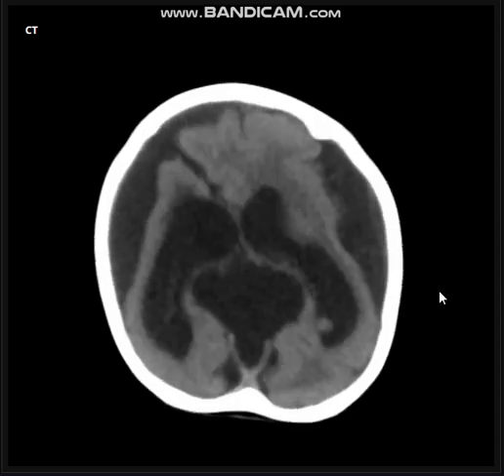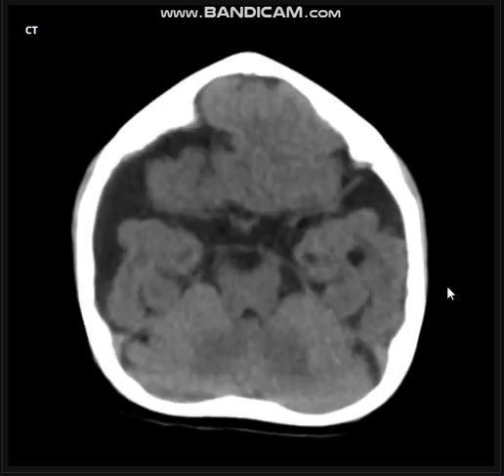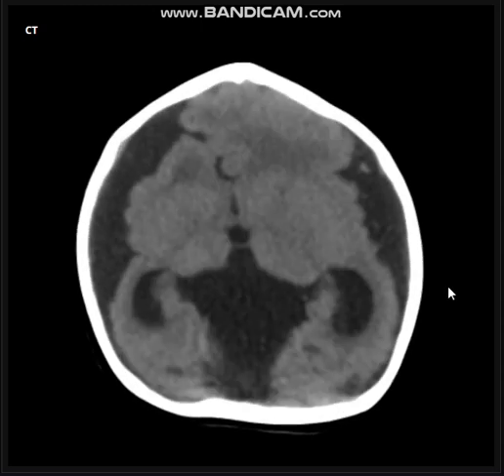This is a 1-year-old boy who is complaining of microcephaly, as I said. Okay, and I will scroll through the axial views and the sagittal and the coronal and the 3D volume rendering, and you try to identify the salient abnormality in this case.